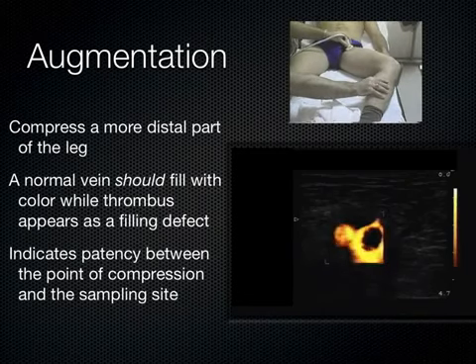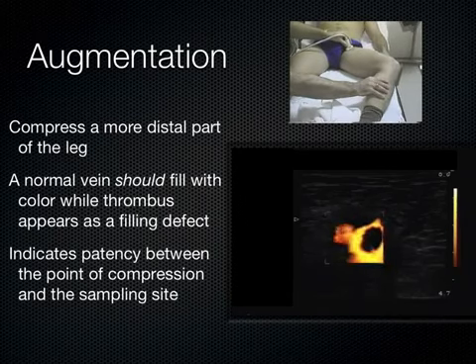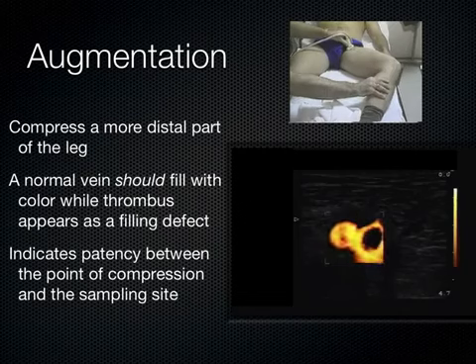I like to teach it to medical students because it gets you involved more with Doppler and color, gets you thinking about that, outlines the vasculature, and you'll see it's kind of fun to do today when you go to practice it. You'll squeeze the calf and you'll see a big blush of flow come back either in the pop or the fem. It's kind of fun to do that. So make sure you do that today.